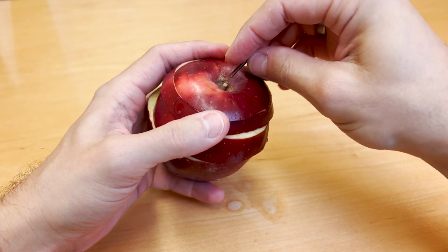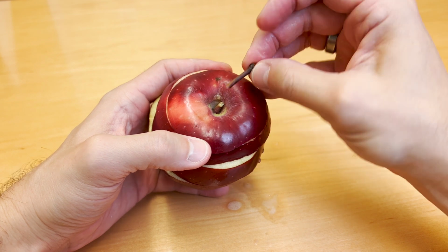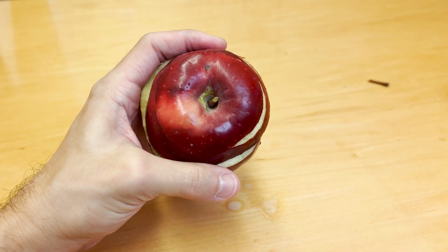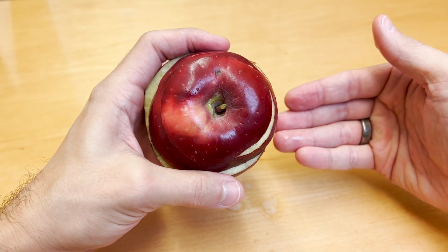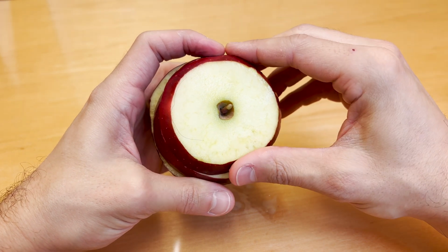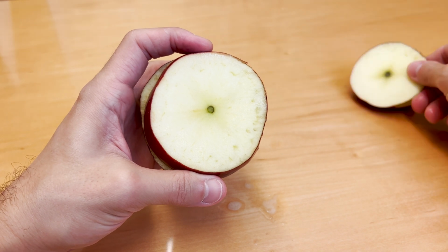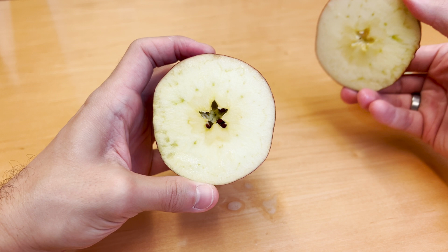I got the stem there too. We can actually use the stem as well. So if we cut through the stem, you can see the only image that we would actually see is right there at the tip of the stem. But as we move through the apple, as our cuts move through the apple from top to bottom, we can, again, as before, see how the cross-section image changes in the apple. So we'll keep moving through, and you can see how that looks.